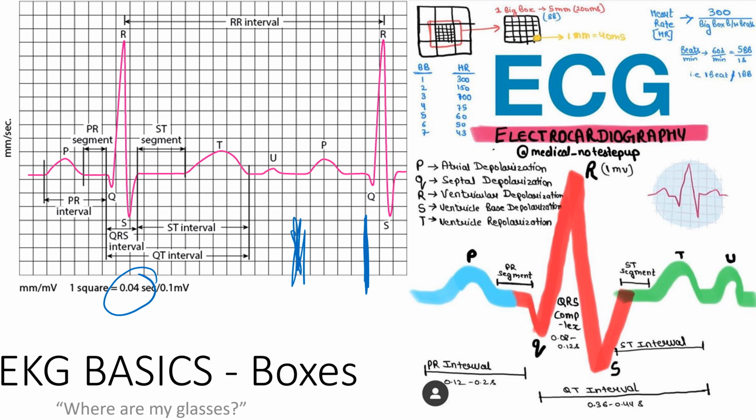We're not going to differentiate them, and you won't in other semesters either, whether it's a left or right bundle branch block. If in clinical you want to know and you want to come to me and ask, we can go over it, but it's not important. All you have to know is that if it's wide, it could be a bundle branch block. The PR is wide, it's usually an AV block.